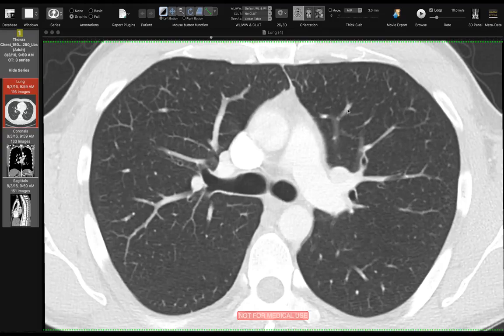In this video, I'm going to be talking about the tracheobronchial tree, and specifically, we're going to be talking about the names of the lobar and segmental bronchi. And it's really important to know the names of the segmental bronchi and be able to trace them out because it will help you localize things like tumors or infections.